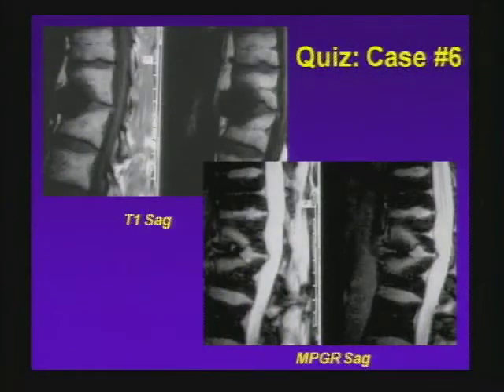Now this is a slightly different companion case, but it's made to illustrate a point, and the history here is not an elderly patient. Think about what the history might be here for a moment. Here you see on T1 areas of marrow abnormality. There are essentially mirror image in these two vertebrae around the disc. They get very bright. This is a GRE T2 type image. And most of the marrow is fine.